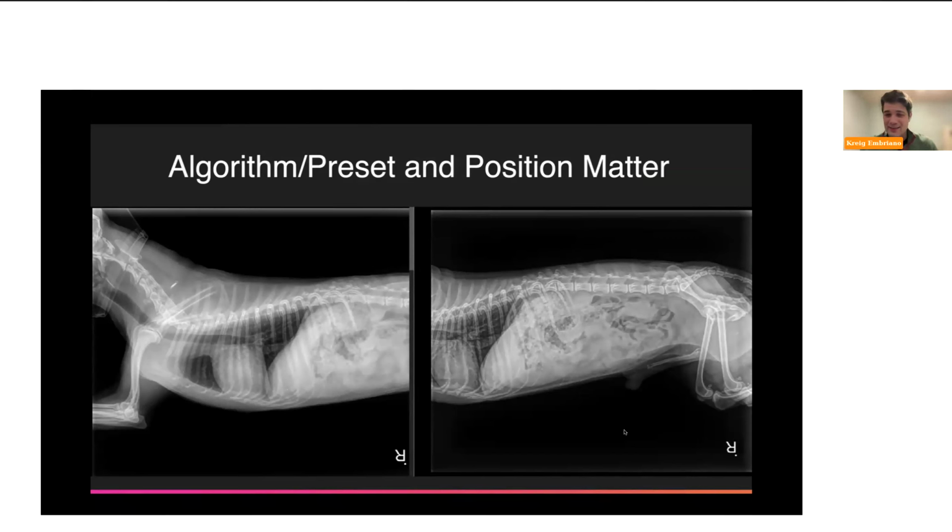And these companies that design these, they design them specifically so that for abdominal radiographs, there's inherently increased contrast. So the machine and the software interprets all those pixels differently than the thorax in order to enhance contrast, because abdominal contrast is inherently lower than the thorax where there's so much gas. And there's really no gas in the abdomen except for within the GI tract. The rest is just fat and soft tissue. So there's inherently less contrast.